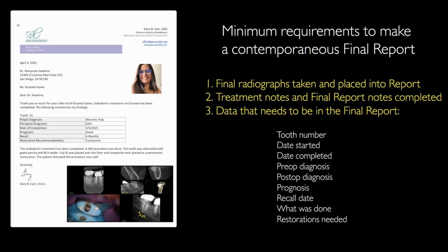One way to dramatically decrease the stress in your office is to make sure you can do your final reports contemporaneously, before the patient even leaves the office. We've thought about this a lot in TDO, and we're able to do this in TDO, and I'd like to show you how we do this.